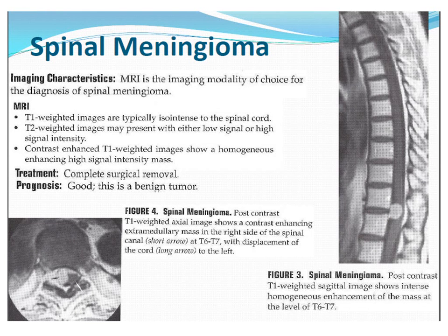How can you tell that apart from that meningioma? Sometimes you can't. Sometimes you can't tell the difference between a meningioma and an ependymoma. That's true. Sometimes you have to just say it could be this one or that one. Either way, both of those lesions have to come out, so they'll get the diagnosis on pathology. And fortunately, you don't have to make a 100% definitive determination at that time. The most important thing is to tell the location and what the effect on the cord is. Is there any edema in the cord from compression and things like that?